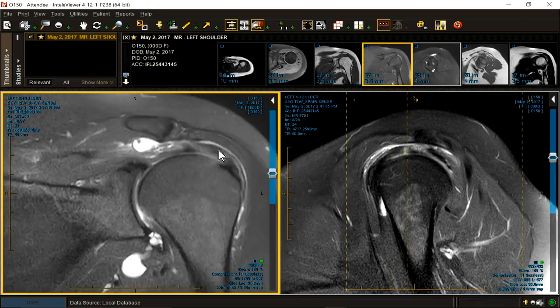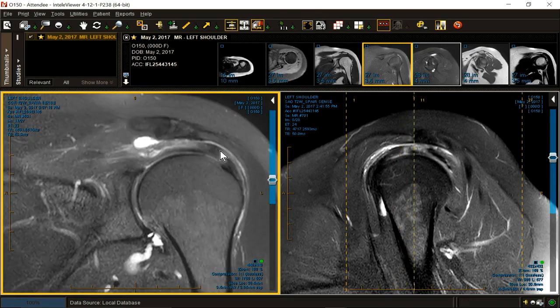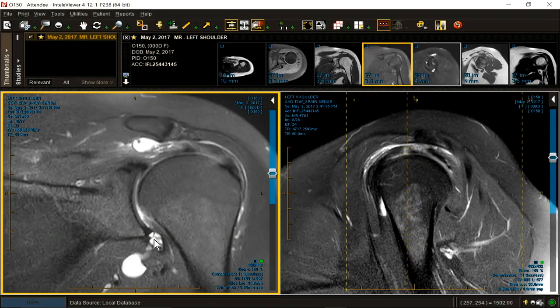I'll describe the size of the cyst and the peritendinitis and the tendon fiber failure. We have another high signal area to address, separate and distinct from the cuff. It's in the inferior labrum. It's an upside down SLAP lesion. Instead of superior, it's inferior. These are not associated with dislocations, the ones with inferior cysts. The cysts usually dissect into the axillary space, and we refer to these as upside down SLAPs or SLAP 11s or SLAP 12s. We won't go into the distinction right now.